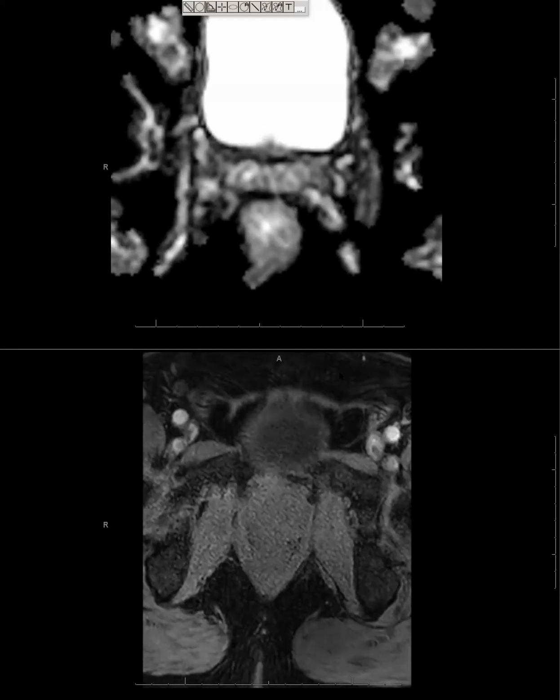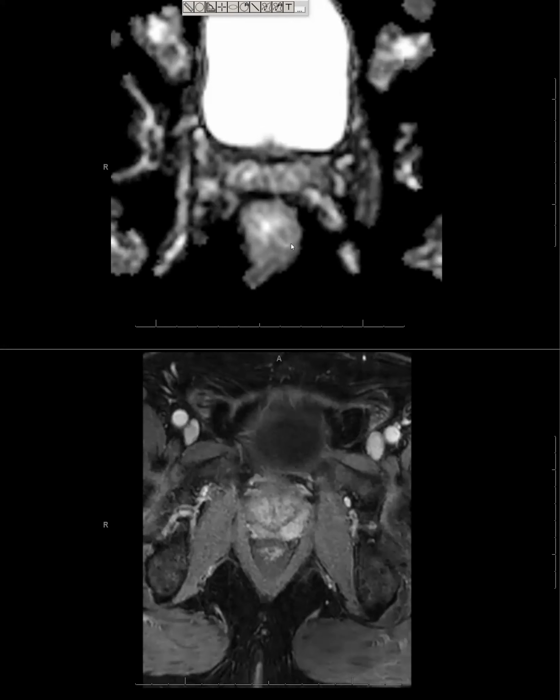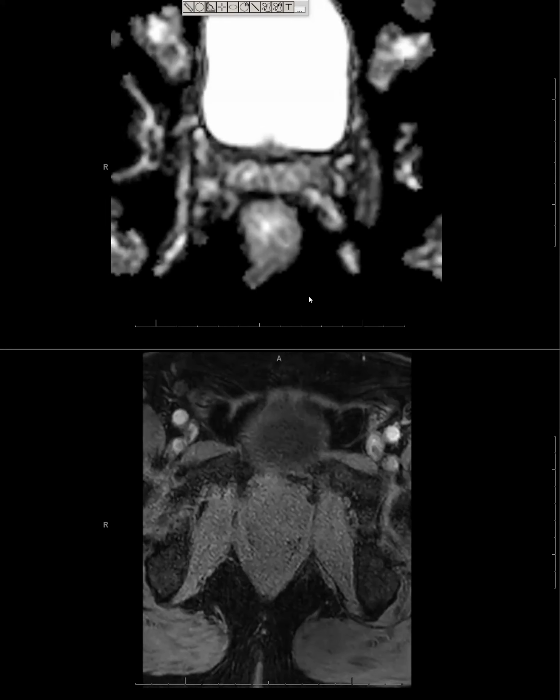Okay. I did the same thing I did last time, which was search my follow-ups for follow-ups. And I found this case. It's a bit of a story. It starts with a prostate that was already biopsied. It happened to be a Gleason 4+5, I think. We didn't need to, but it's a PIRADS 5, so there's restricted diffusion.